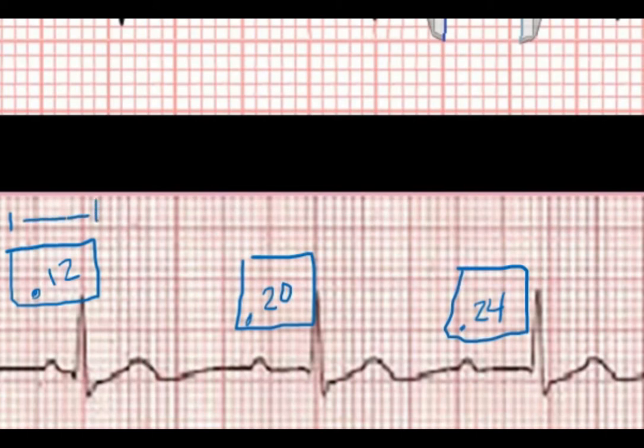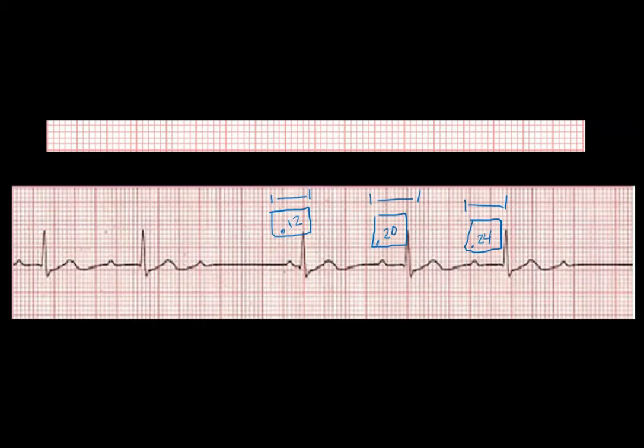So if you're looking for descriptions of it here, you can see kind of how these things go, right? So they get longer. There is a definition for that, and there's an EKG identification definition for that. So that gives us an idea of things that we can look at. Again, following those rules, making them simple, we're just measuring time. That's time going across that horizontal line, right? That's what we're concerned about, okay?